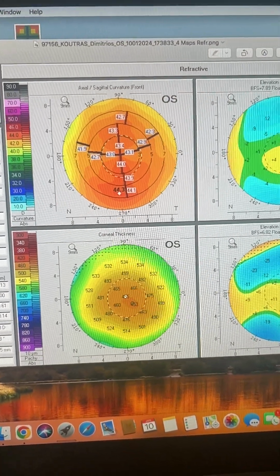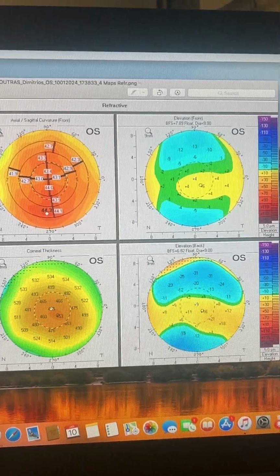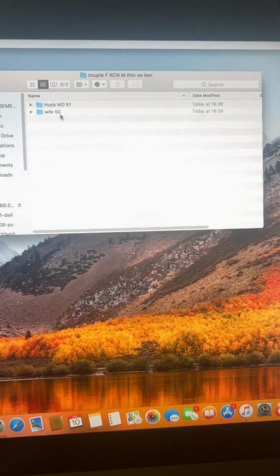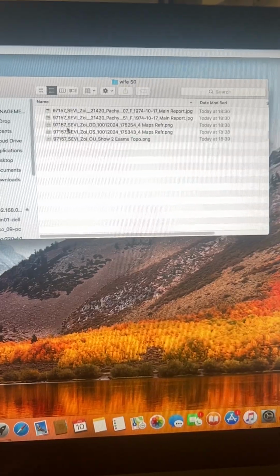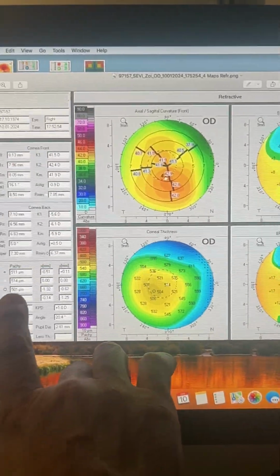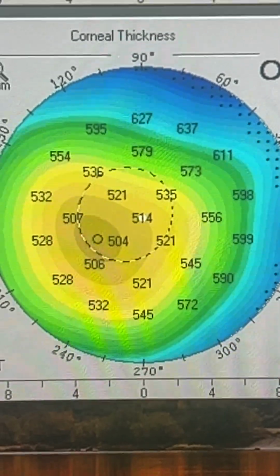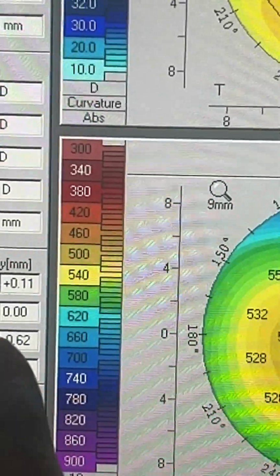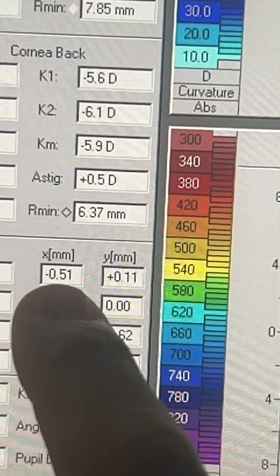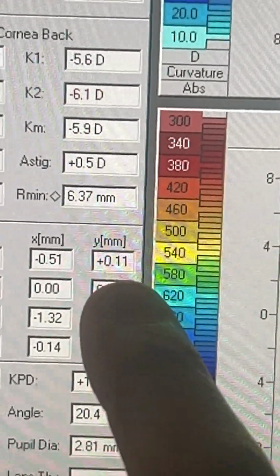And surprisingly, once I've explained all this to our colleague, with the wife being present, who was also wearing +2 trial contact lenses, we went on to see the wife's corneas. And this is what we saw. And sorry for me smirking, because the wife has thicker corneas, 501 microns, but as we said before, the pachymetry distribution is classic for keratoconus here. Angle kappa is 500 microns on the x-axis, 100 microns on the y-axis.